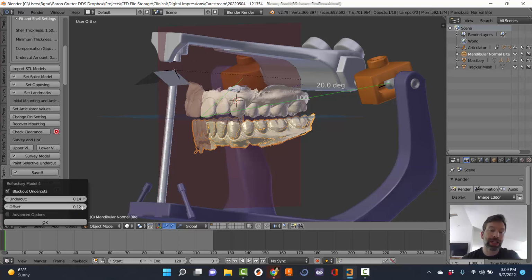For this case, I'm actually going to leave it at stock, because I'm trying to get closer and closer to not having to mess with settings. Although I don't think I'm ever going to be able to, I should say I need to mess with this setting, but maybe I can eliminate having to mess with the offset. So let's just see if this fits her, and we're going to leave it. I know that 014 and 016 will work, but it might be a bit snug. And I've had one patient this week comment on hers being extremely tight. So yeah, we're going to be making her a looser one.